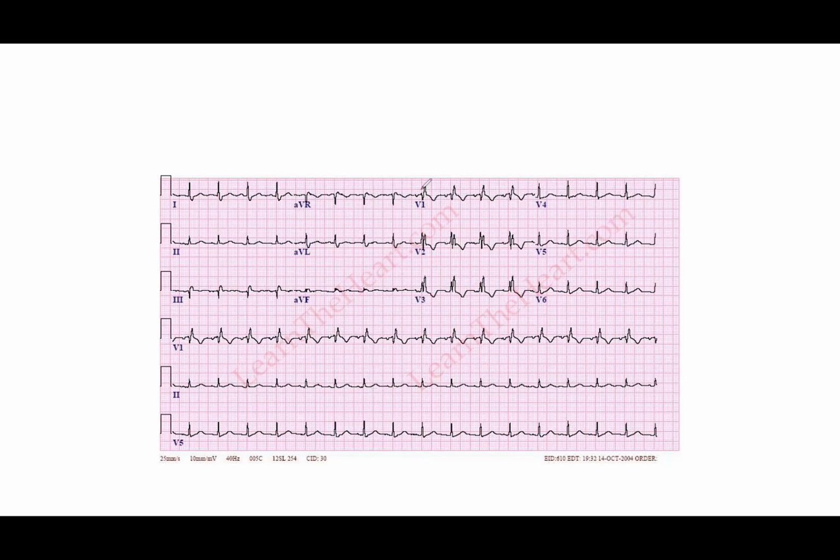So where are we going to look? We're always looking at V1, lead 1, V6. Now, our criteria for a right bundle branch block is different than a left bundle branch block. So because V1 has a positive deflection, because the baseline's like here, right? Or there. Because we have a positive deflection in V1, that means that we probably have a right bundle branch block, because right bundle branch blocks go up in V1 and lefts go down. But we got to confirm in lead 1.